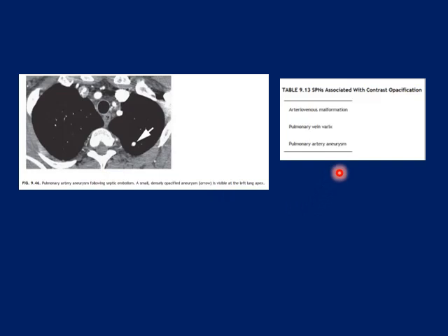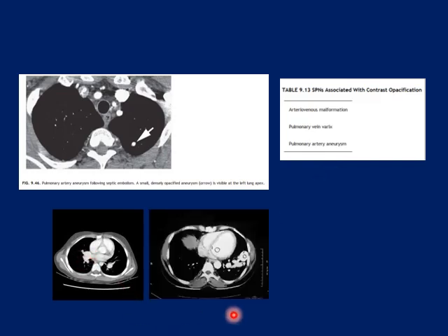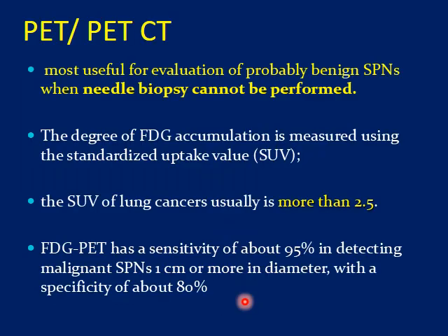The other concept, which is easy for us to see, is that the lesion is enhancing like nearby vessels, following the common pool of contrast within the nearby vessels, whether they are the aorta or veins or something. This means that this is a vascular lesion. Okay, we can see this in pulmonary arteriovenous malformation, pulmonary varix, and pulmonary artery aneurysm. This is an example of pulmonary artery aneurysm, arteriovenous malformation.